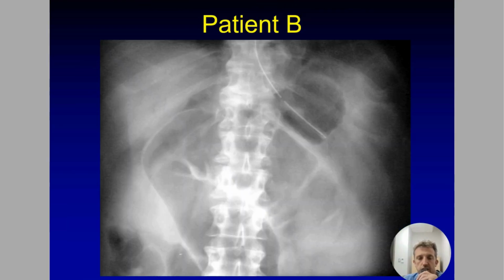What if they're too sick to lie on their side, or we just get a supine radiograph? Well, let's look at this image. Lines and tubes first. Feeding tube going in the stomach, that's good. Bones okay, no mass or mass effect.